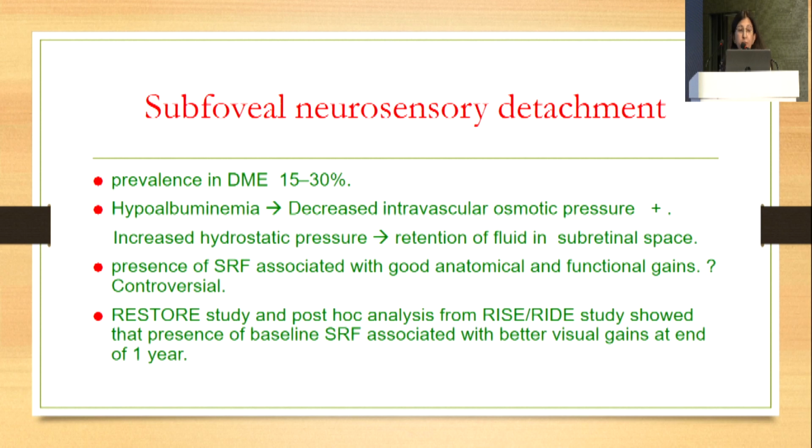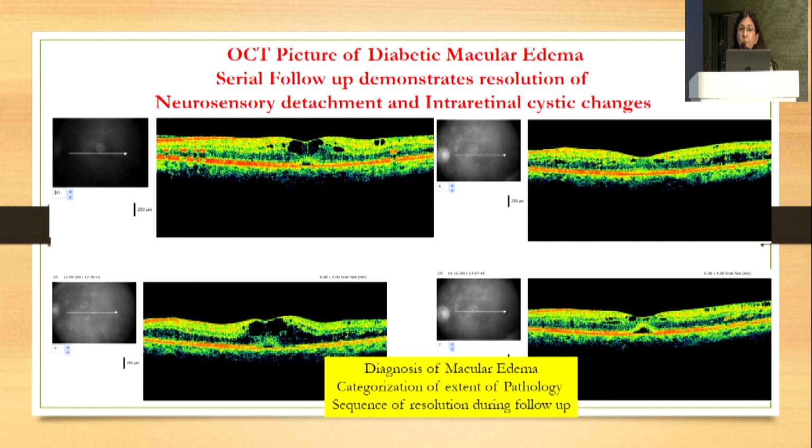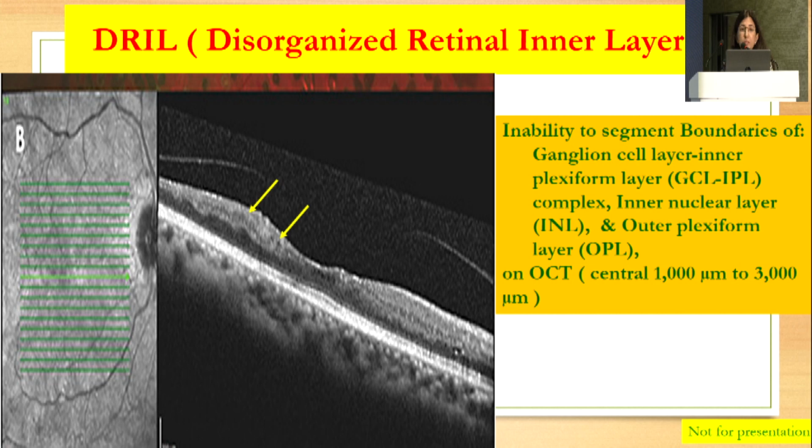Coming to SRF, in some studies it has been shown, like RESTORE and RISE, that presence of SRF actually is an indicator of better visual gain in the long run. So this is just a patient showing a resolution of edema with treatment, anti-VEGF injections.